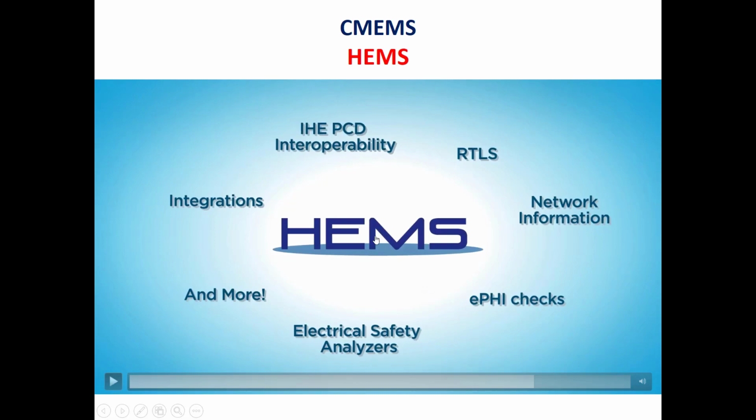Also, the connection directly to the patient's EMR, or electronic medical record, or electronic patient record. Also, one of the features of the HEMS system is the ability to connect with the electrical safety analyzer or biomedical equipment testing and other features.